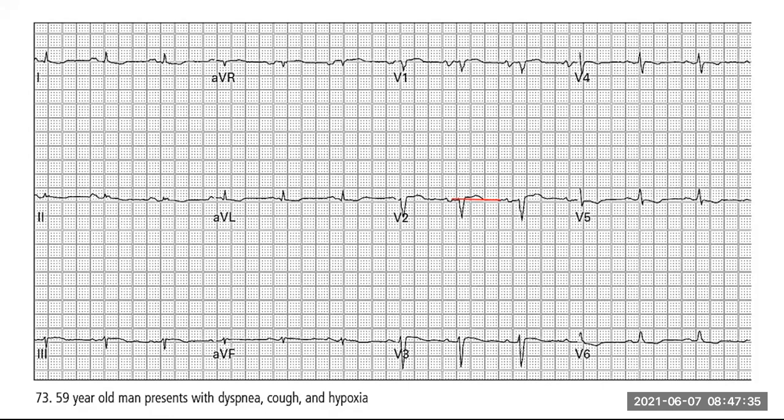However, we were giving an example of this patient going to ICU. That's why we did the ECG, so that's why we're having a look at it. But what it means is that when your patient goes to ICU, you add on extras. I've added on my cardiac enzymes because I'm worried. Is this ischemia as well? There's quite a bit to say that it could be ischemia. Have I looked at an embolus? Yes, I have. Anytime you get these T-wave flattenings and inversions, you've got to think of that as well, even though it doesn't have everything.